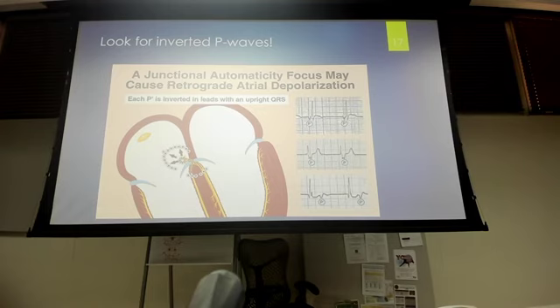And sometimes you even have P waves that occur after the QRS complex because of that retrograde depolarization. We have a P wave here that's occurring just before the QRS, and it's inverted here. This P wave actually is afterwards, it's within the S wave, and then we've got a P wave that's way over here. We're not going to see anything like that on the exam.